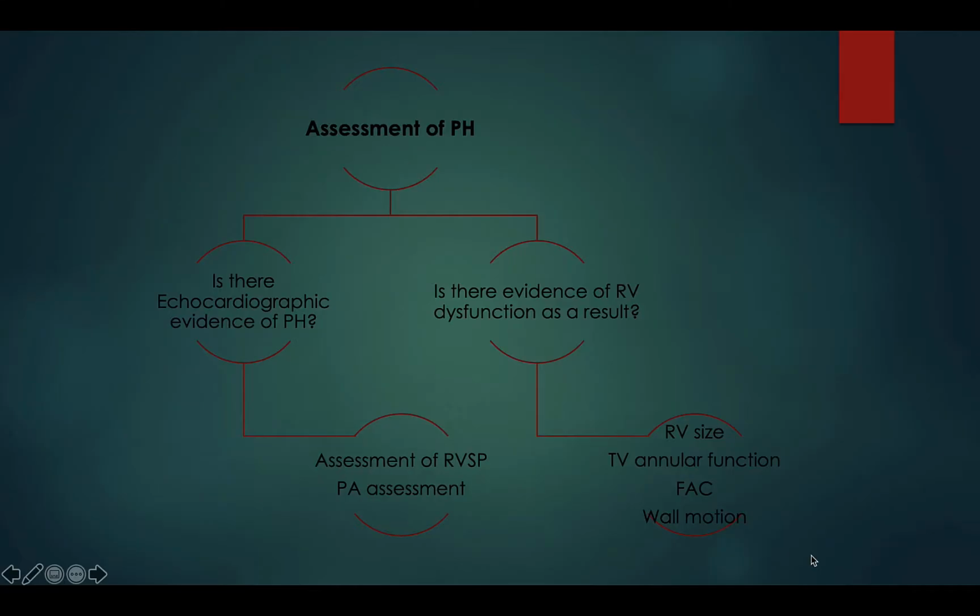As a reminder, last time we spoke about some of the ways you can interrogate pulmonary pressures in the bedside echocardiogram. Today, we'll look at some of the downstream effects on right ventricular function and talk about some of the markers of RV dysfunction. Although there are more of them, they are conceptually simpler to understand and rely on more basic two-dimensional and one-dimensional imaging, and so we'll be able to move through some of them a little faster.